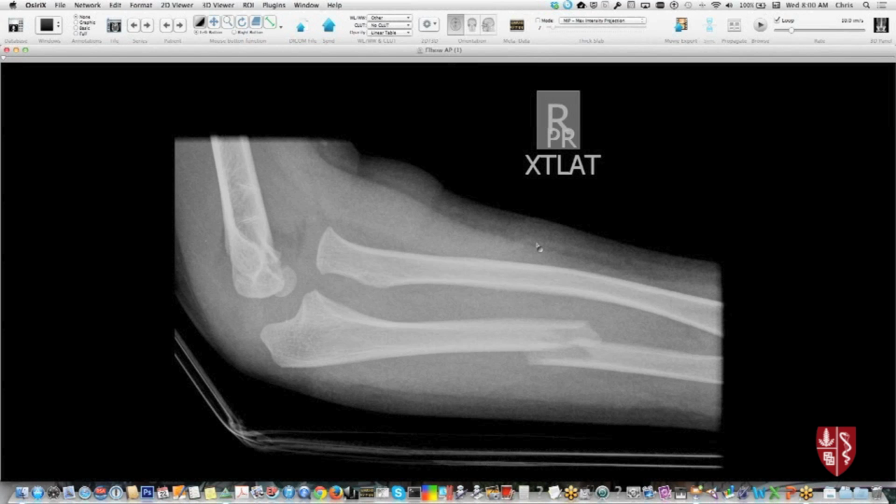And just remember the whatever the mental hook is you're supposed to use, the mugger, Monteggia ulna is the fracture, Galeazzi radius. So this would be a Monteggia type injury because the ulna is the thing that's fractured. Monteggia ulna, Galeazzi radius.